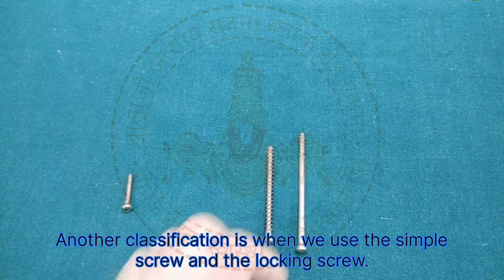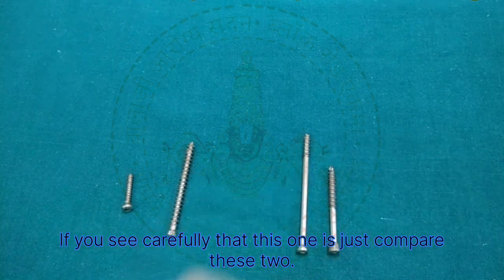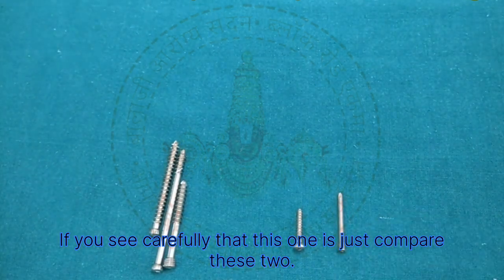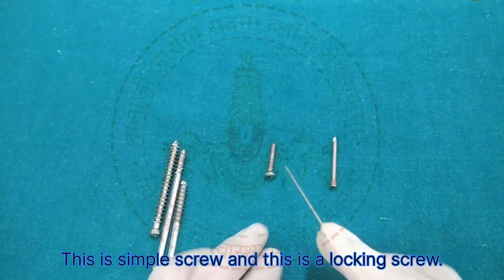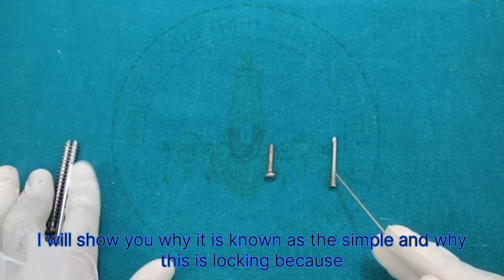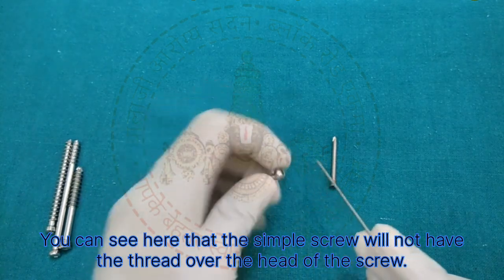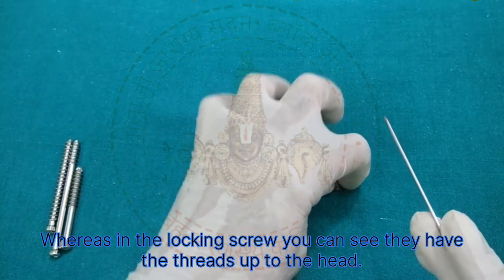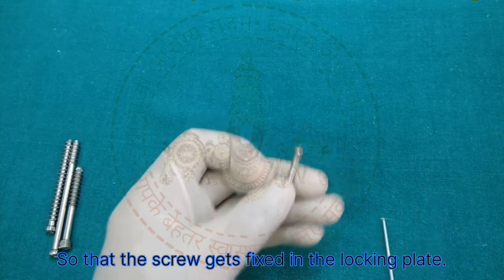Another classification is the simple screw and the locking screw. If you see carefully, just compare these two. This one is a simple screw and this is a locking screw. I will show you why it is known as simple and why this is locking. The locking screw has threads over the head also. You can see here that the simple screw will not have thread over the head of the screw. This is the head of the screw, whereas in the locking screw, you can see they have threads up to the head so that the screw gets fixed in the locking plate.